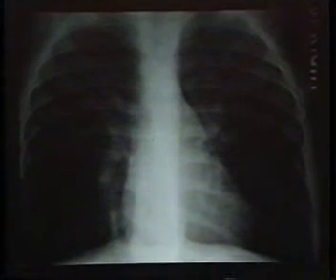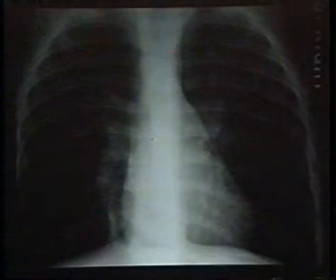These patients also have respiratory infections. Interestingly, Eric, we have noticed a very small percentage of patients that have had localized air trapping with this, but it is infrequent as you described, but we have had a few on expiration that had an element of air trapping. The high kilovoltage film in this patient beautifully illustrates the narrowing of the distal trachea and the displacement a little bit to the left by the right arch.